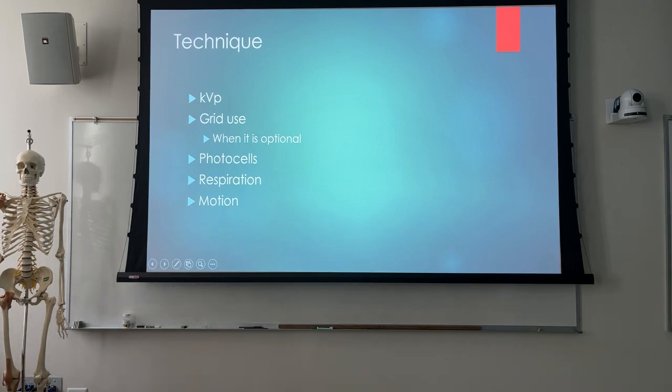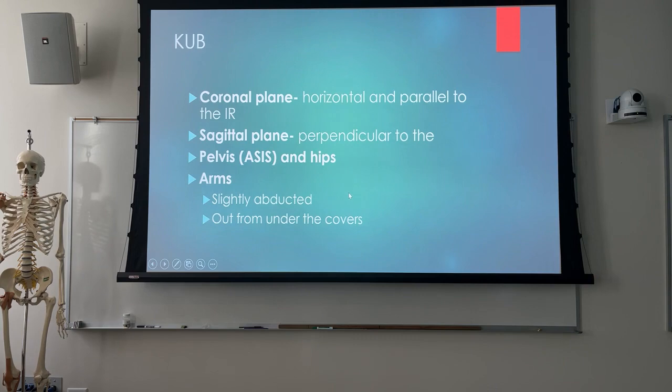If your exposure time is long enough, you may introduce some two types of motion. Involuntary, thank you, I couldn't come up with a word. Involuntary motion, some bowel motion.